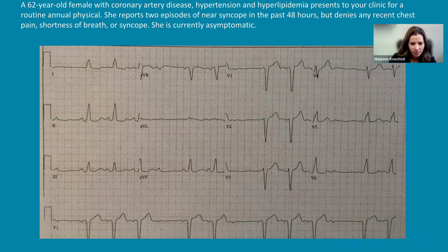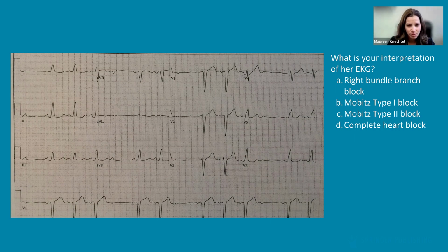All right, so we'll take a look at a question, and you can look at the EKG a little bit longer. So this one, just want to know, what is your interpretation? What do you think is going on?